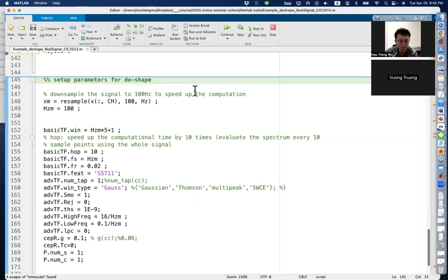If you remember, that is because the maternal ECG and the fetal ECG are both non-sinusoidal, oscillatory, and so on. So if we do not use Dshape, but just use the traditional short-time Fourier transform or synchrosqueezing, then you will get a lot of junk. Although it's not that they are not useful, it will be very challenging to do the interpretation.